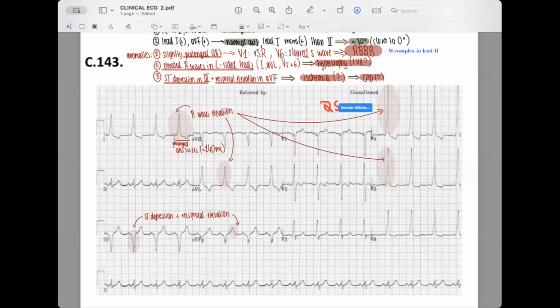But you haven't said anything about the P wave. The P wave. It's not really there. I mean, yes, there are. For example, here in lead number 2, you can see it. And here, lead number 3, you can see it. And if you go here, you can see it because that's a P wave, yes? And right behind the P. And here is a P wave, yes? And here is a P, yes? And right after the P, the QRS starting with a notch.